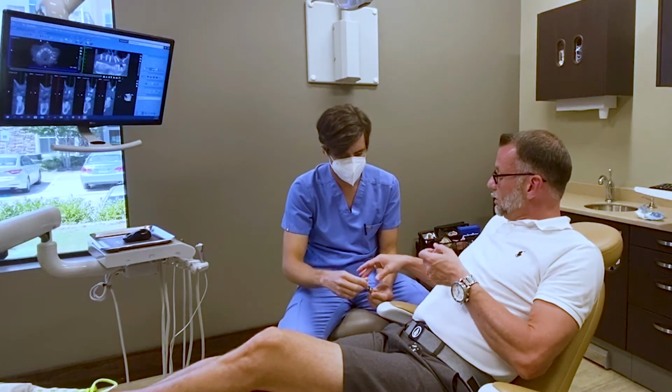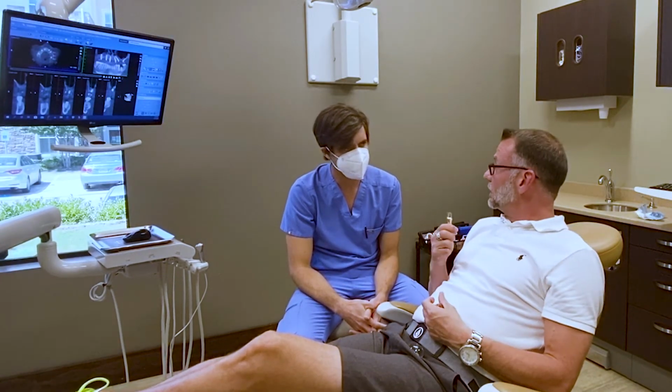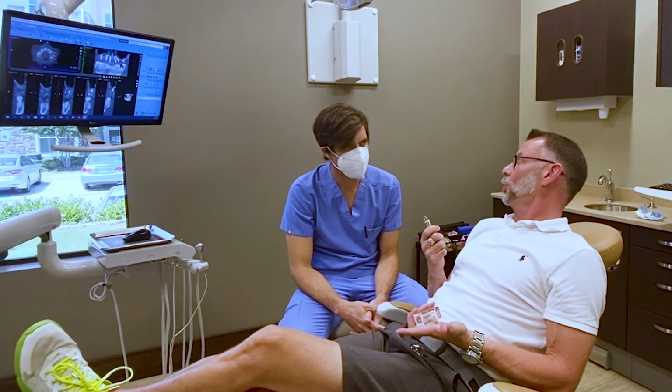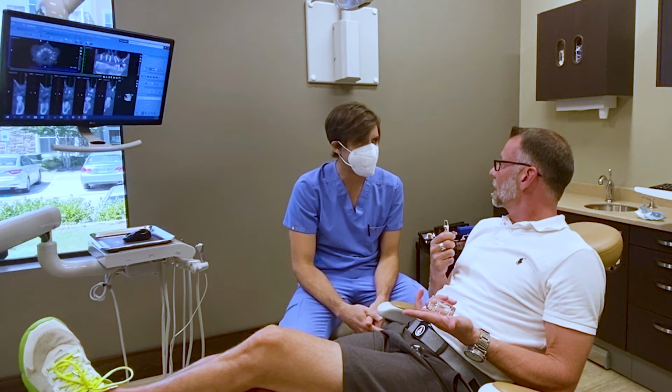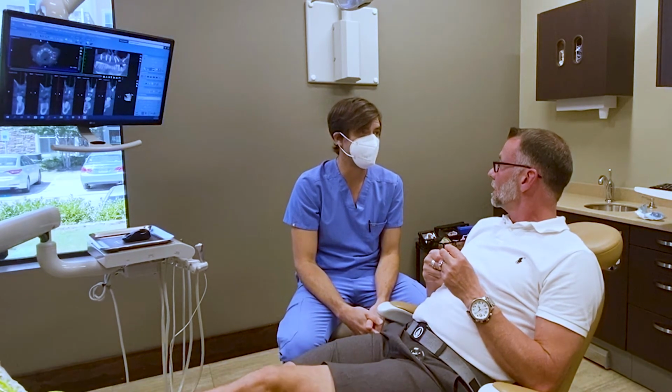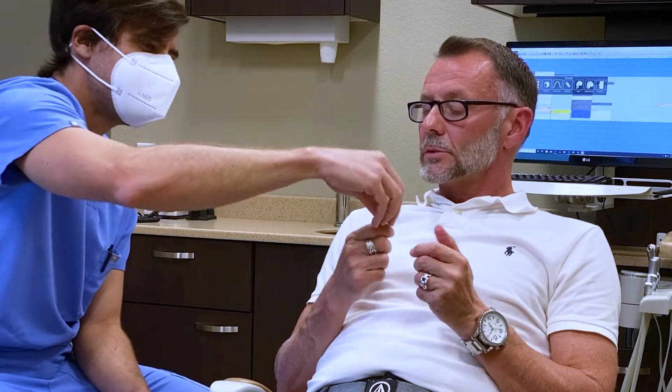Okay, a multi-unit abutment. What's the difference between this abutment and a multi-unit abutment? Why don't I know this after all the things I've heard? Okay, multi-unit abutments are the ones used to restore multiple units. For example, this abutment will restore one crown. Yes. Right, and then the other one will restore multiple.